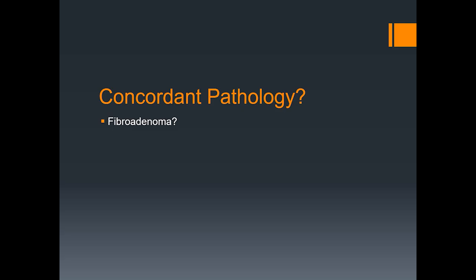Is a fibroadenoma concordant? I would say yes. In this patient population, assuming that we're seeing her in a screening paradigm, and we could, without the benefit of comparisons, not make too many decisions about relative growth, would a phyllodes be possible? Given this size and these imaging characteristics, I would say less likely, but certainly in the differential diagnosis for concordance.